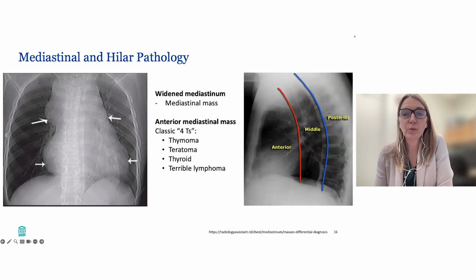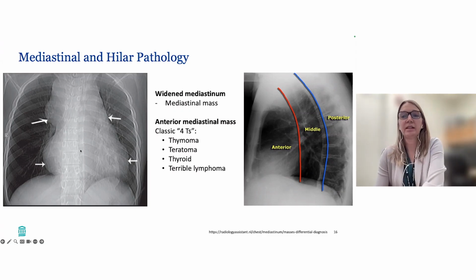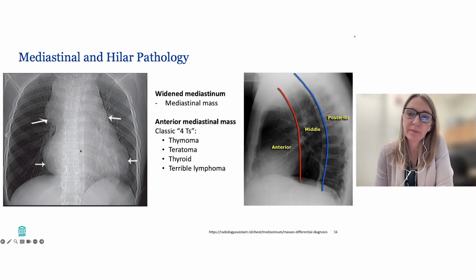Not all mediastinal widening is aortic dissection, and that is why clinical context is so important. Here is another chest x-ray showing a significantly widened mediastinum due to a large mediastinal mass. This particular chest x-ray is a lymphoma, and it has enlarged the cardiac silhouette as well.